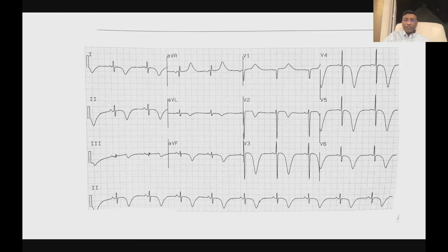This is a neurologic EKG. This is the one that you'll see in the neuro ICU, more than in the CCU, strangely. So even though it looks that dramatic, the QT interval is also prolonged, which I'm not sure if you mentioned. You see how long the QT interval is.